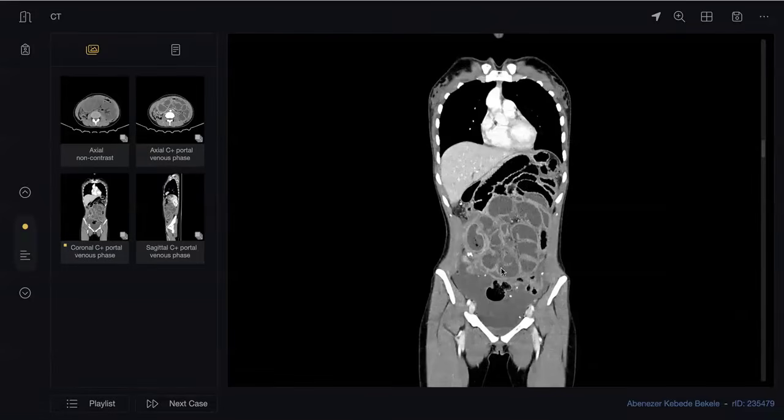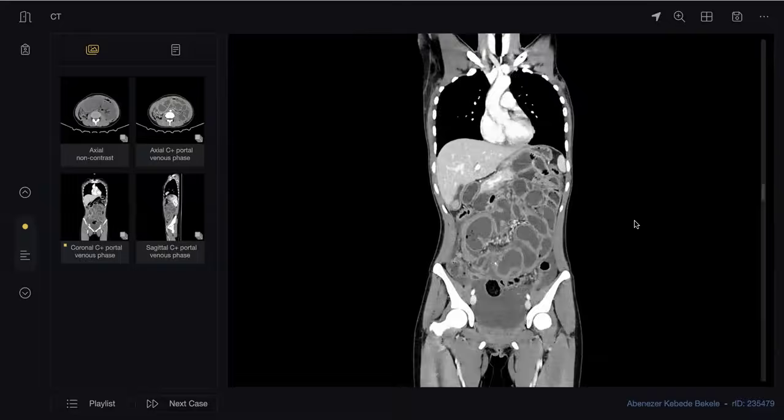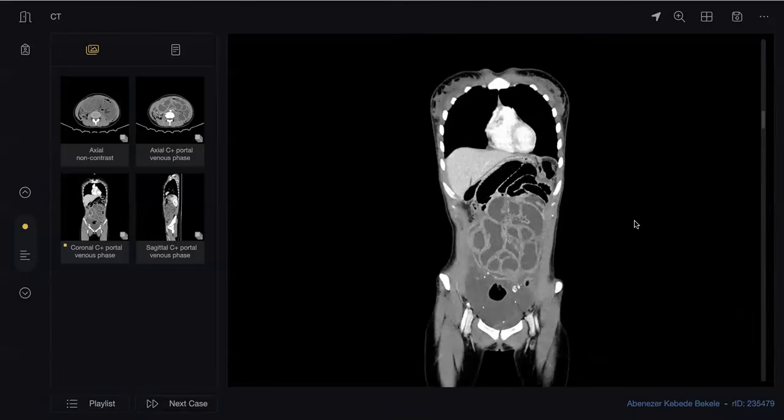Okay, just stop right there. Just leave your mouse. You need just this image to make the diagnosis. The only thing which comes to my mind is the presence of a cluster of bowel loops there. One cause, as you told, was internal hernia.